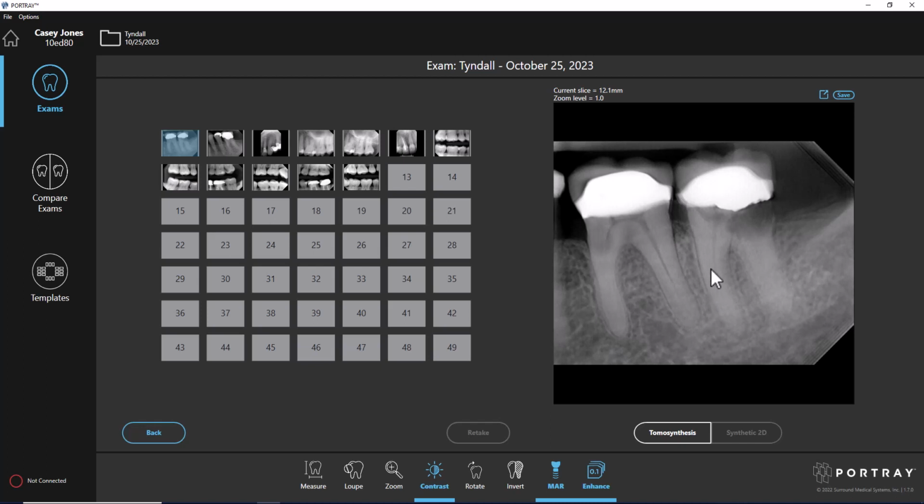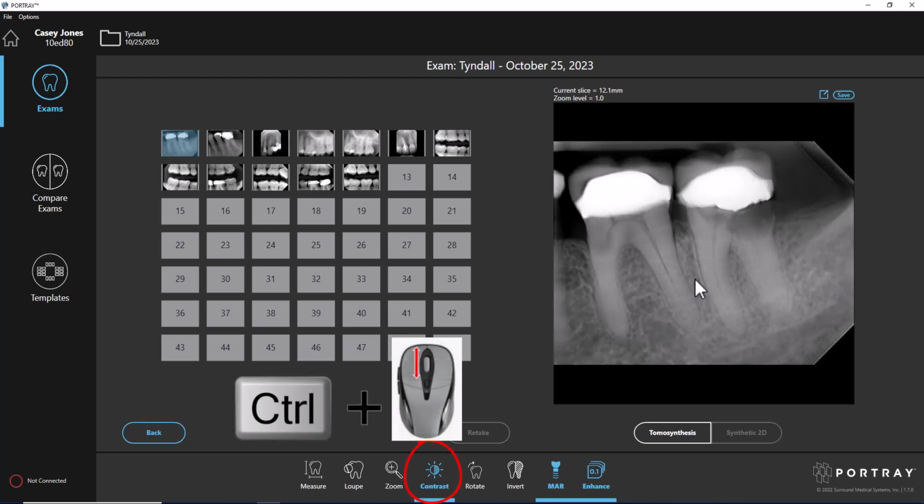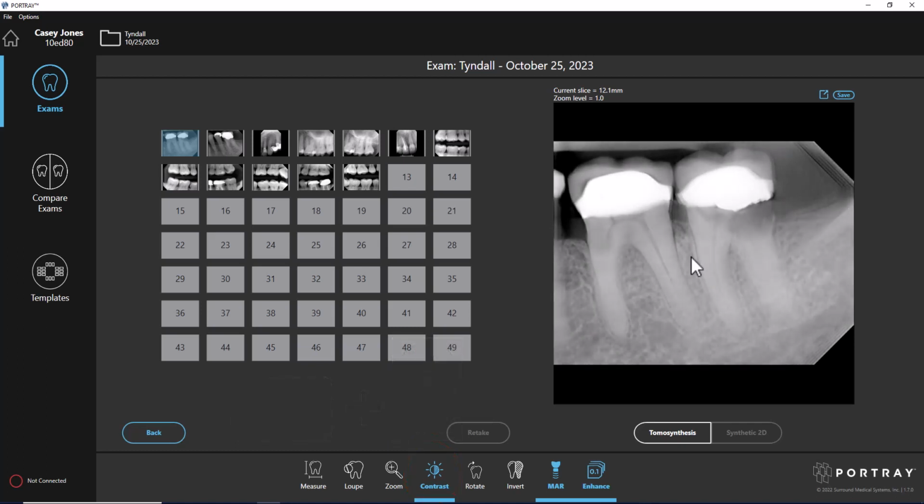You can also change things a little bit by contrast and brightness, or using the gamma, where one finger is on the control and the other is scrolling. You can lighten the image a little bit with the gamma. You can see a little bit more periodontal detail that way. Or you can make it a little bit darker where caries becomes a little more evident. Or you might want to think about using the gamma to better balance your images. That's a general orientation. And I think we'll go to another image and see a few more things.